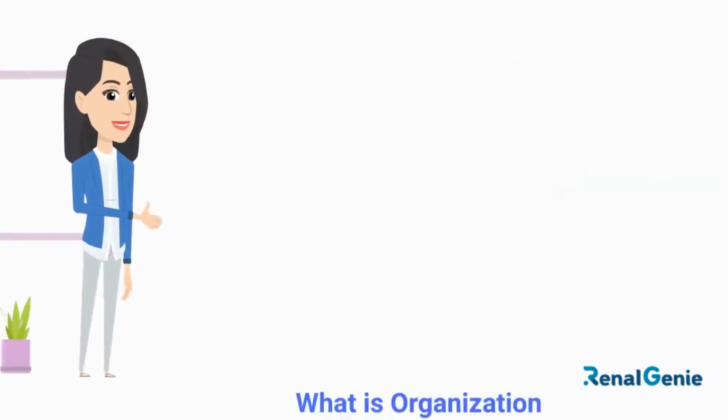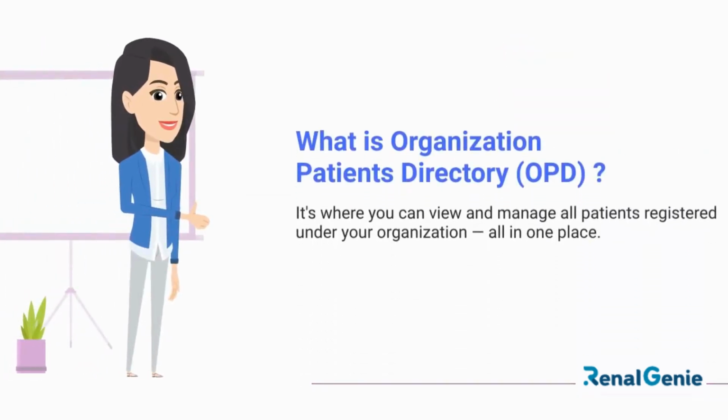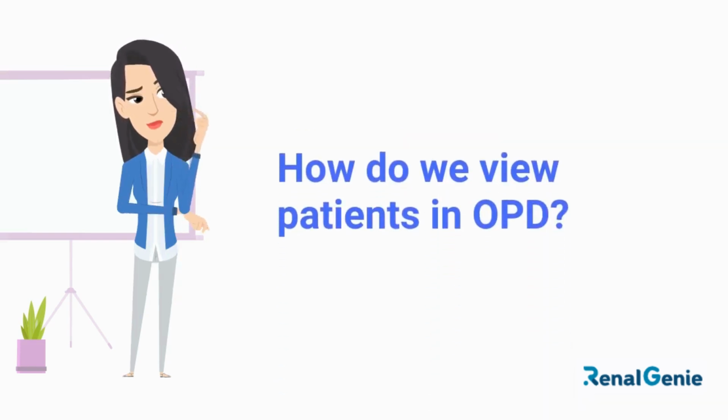What is the Organization Patients Directory? It's where you can view and manage all patients registered under your organization, all in one place. How do we view patients in OPD?